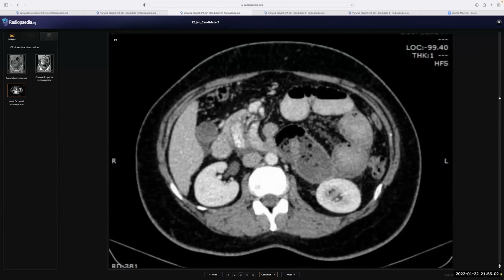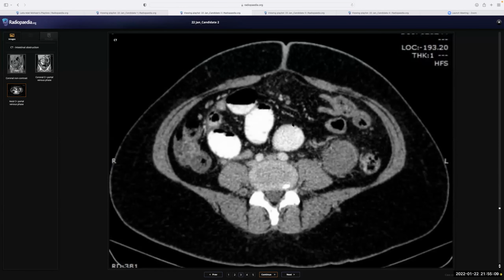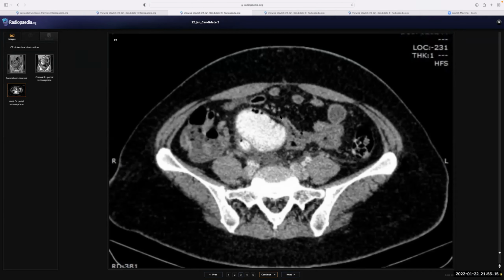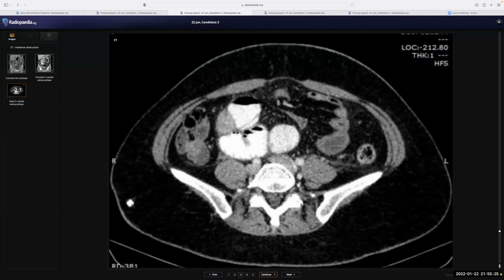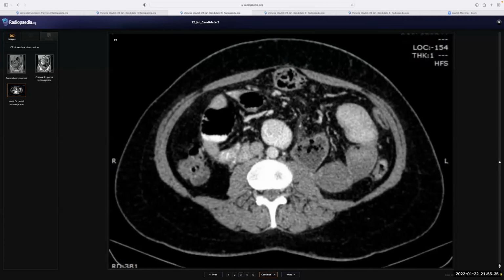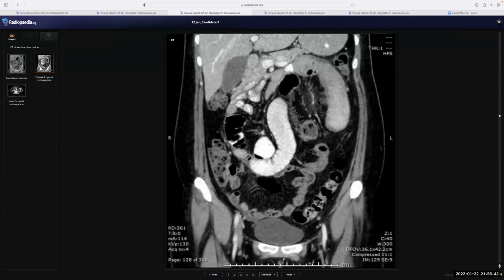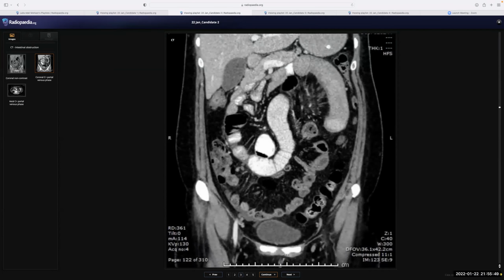So these are the dilated bowel loops. As I go down, I can see the distal ileal loops are collapsed. So at this point, my emphasis is: where is the transition point? These are the distal collapsed loops where my arrow is. I'm trying to find the area where the transition is. I'll look once at the coronal contrast enhanced CT as well. So there is significant mesenteric engorgement around these dilated bowel loops.